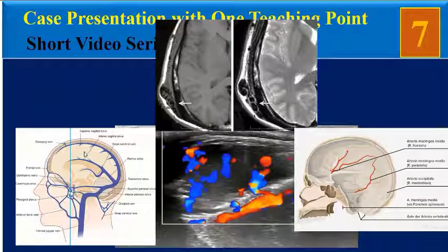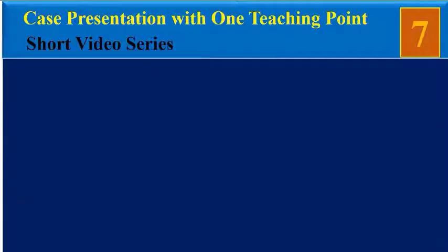The patient had no other request, but we decided to take a skull X-ray, and after taking the skull X-ray, we were surprised by these images.